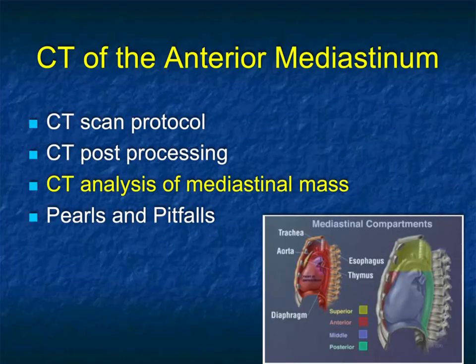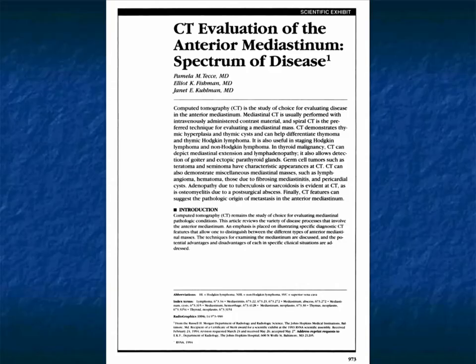And you can see the location. We talk about that being up front, behind the sternum, in front of the aorta, just classically shown on this diagram. When people do talk about the mediastinum and they give lectures, they classically will divide things into the anterior mediastinum, the middle mediastinum, and the posterior mediastinum. Sometimes people talk about the superior mediastinum, but usually it's those 3 points that tend to be most important.